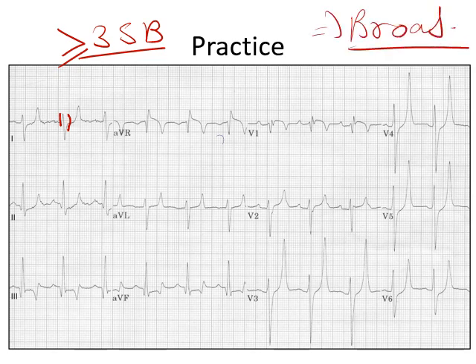Then you guys can see that again in this ECG as well there is a RSR dash pattern, perhaps small r dash in this one. So R, then S and R dash, again indicative of conduction delay in the right bundle branch block. We will talk about it in detail in the lecture on bundle branch blocks.